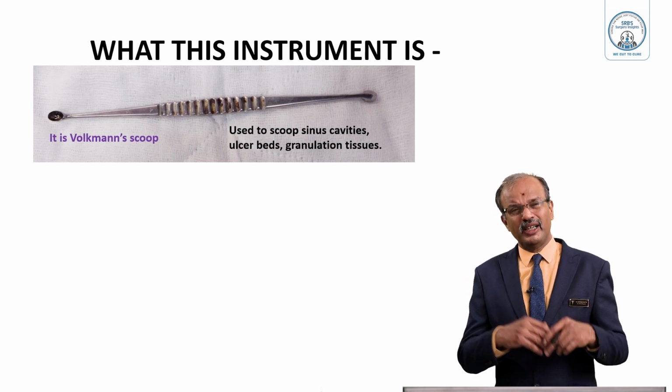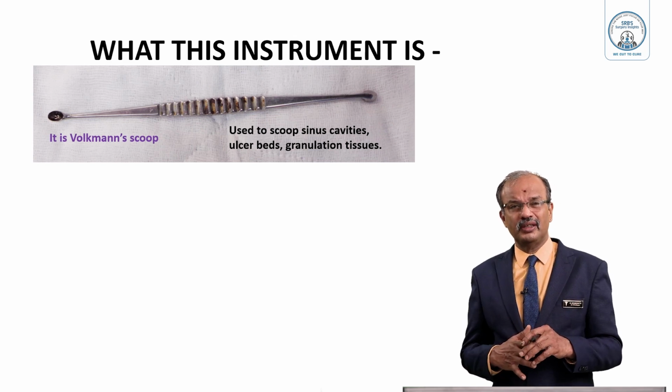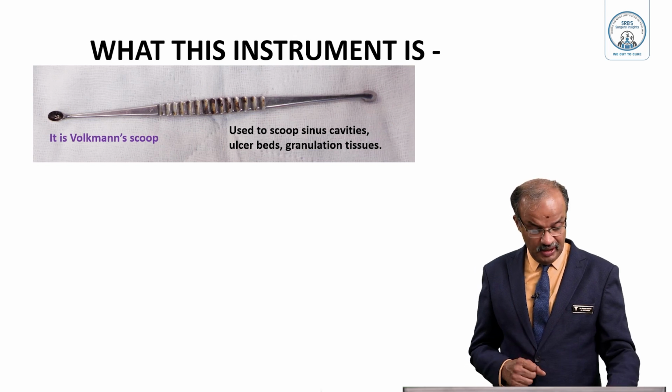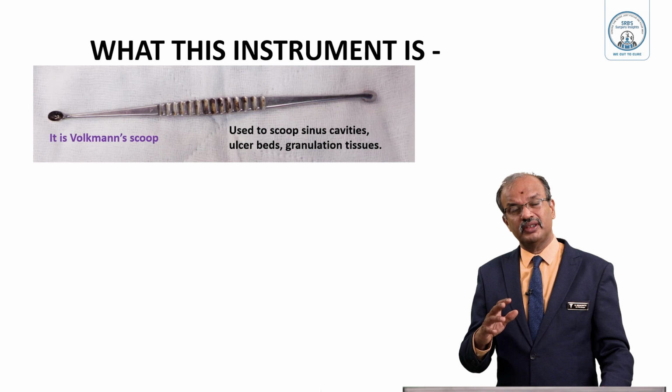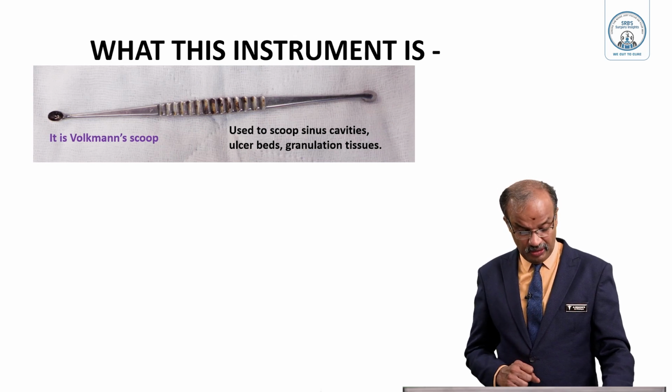Sinus cavities, ulcer bed, different places it is used, especially in surface diseases as such. Ulcer bed in many areas. So this is a Volkmann's scoop commonly kept in OSCE, viva they will ask. So mainly practical exam, this scoop may be kept. You should remember this one.